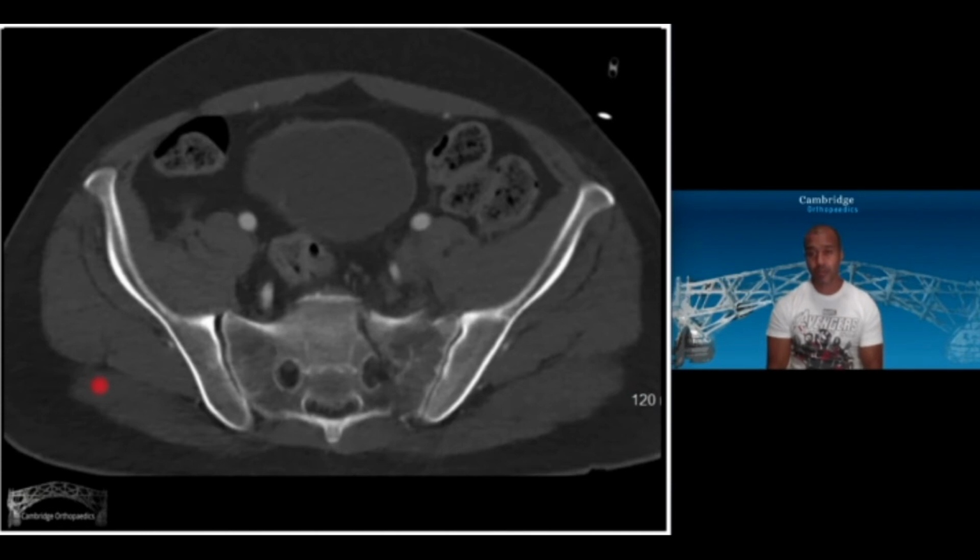If only there were better sound effects that were possible. But so one side has gone in, donk, and the other side has gone out, donk. Perfect. So this is an LC3, and I hope that's all clear. No great deformity on this one, I have to say, but there's more to follow.